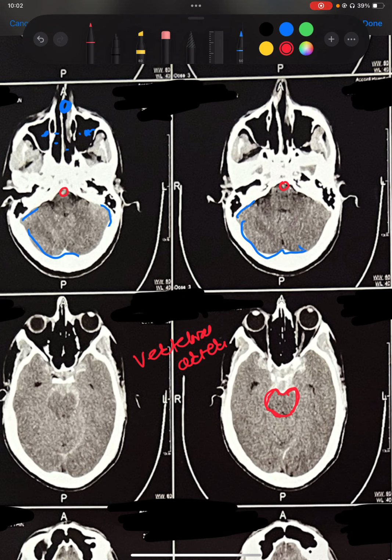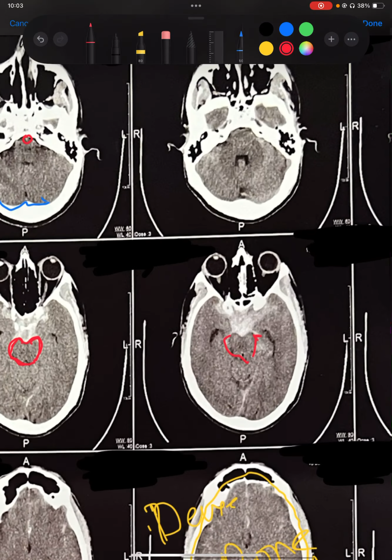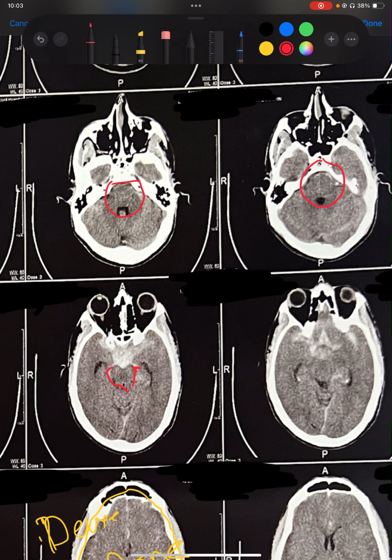This is very, very important because basilar artery strokes and bleeds are extremely dangerous, because the brainstem, this pons, midbrain, medulla, contain the vasomotor centers, respiratory centers, blood pressure centers, vagus. If the patient gets an infarct or bleed in this brainstem area, most patients are brain dead within 24 hours. So aggressive treatment is very important, whether it is infarct or bleed, whether it is subarachnoid hemorrhage. Here there is apparently no bleed which we can see.